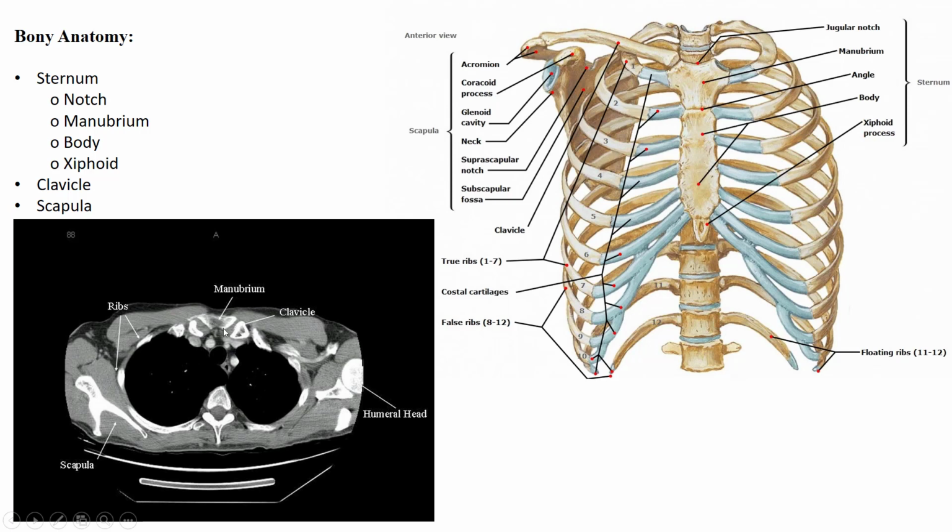And this is the manubrium here, so we're up at about this level here on the first and second rib. And this is the sternoclavicular articulation here, so there's a clavicle as it comes across the joint. If you were superior in the body, you would see this clavicle as it comes across, and you might even see the acromioclavicular articulation out here as the acromion process comes across from the scapula and attaches to the clavicle.